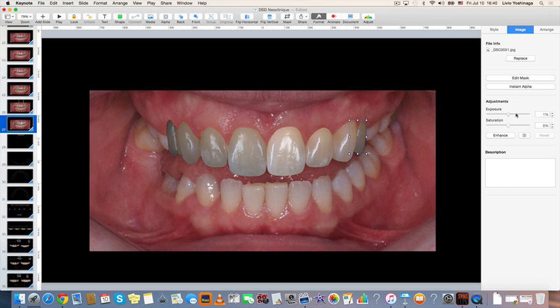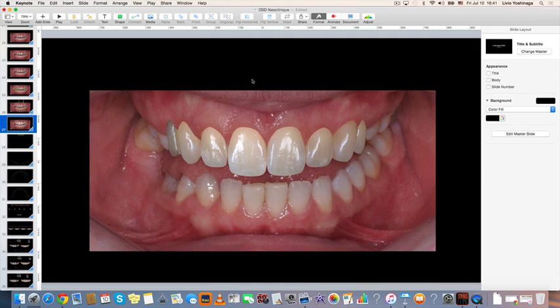So premolars, you should by now, we're recording this movie at Nail Clinic in Bucharest in front of our beautiful audience. And you should by now be thinking, what is my next step? I think it's a nice exercise for you. So now this is good.